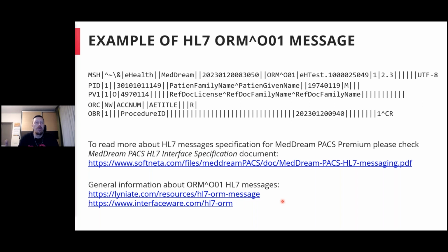If you want to get familiar with these types of messages, basically these messages store information. For example, the PID segment stores the patient ID, patient name, birthday, gender, and so on. Or the OBR segment would store information about the procedure, scheduled procedure time, modality, or it would provide the accession number, title, and so on. So this is a very simplified message, which we will try to send to the MedDream PACS Premium HL7 listener to create a worklist.